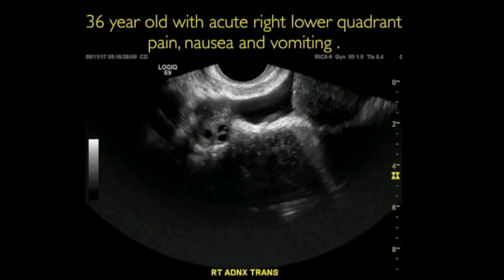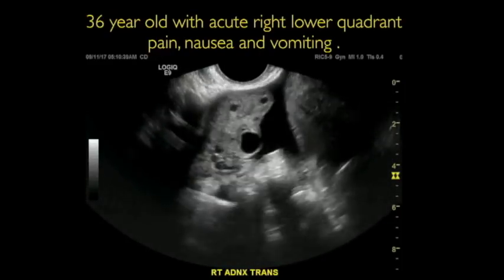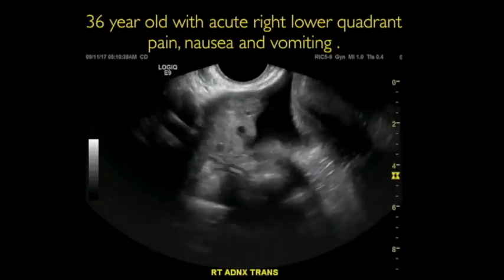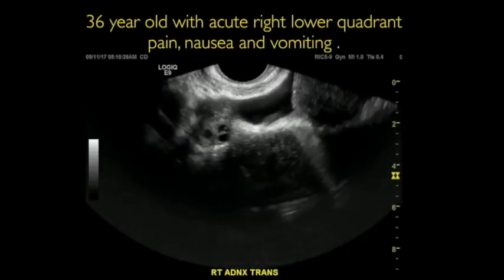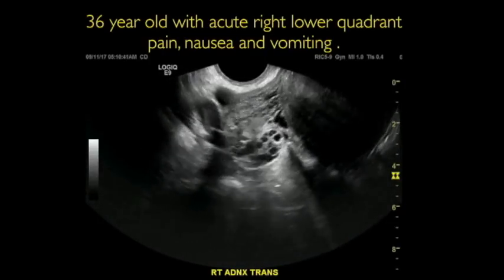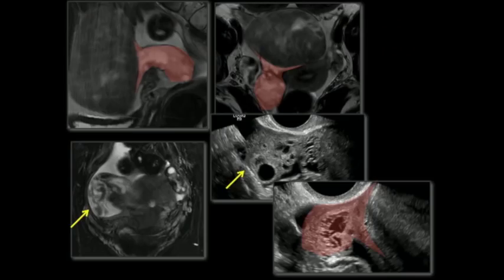Here's another patient, 36-year-old, with acute right lower quadrant pain, and nausea and vomiting. And on the cine, it was really hard to find the ovary. Free fluid. And you say, well, it kind of looks like a twisted vascular pedicle, and there's a huge mass. Is the mass coming from the uterus or adnexa? And in this case, we figured we're dealing with a torsion. Could it be possibly a necrotic fibroid? And then we moved on to the MRI, and that beautifully shows you that there's a claw sign from edematous tube and the ovary, and this was a torsed fibroma, which led to this process here.